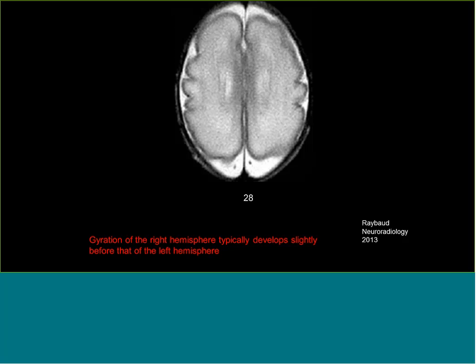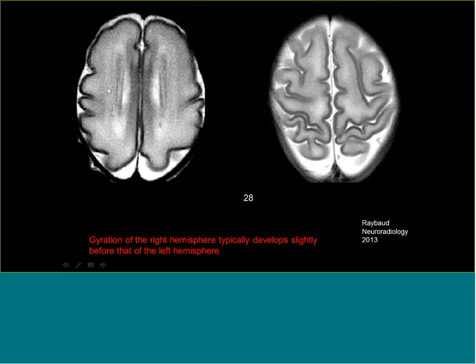Though Dorothy and her team are always very good at letting me know when there's some kind of a situs inversus or ambiguous. So anyway, by 28 weeks, you get more gyri that we can identify. At 30 weeks, you can see that they're deepening. And already by 33 weeks, almost all of the primary sulci are present. And what will happen after that is that the sulci are going to become deeper, and then they will branch out into secondary and tertiary sulci.